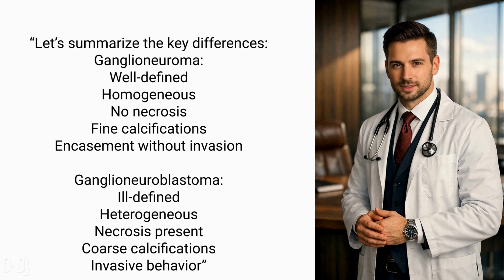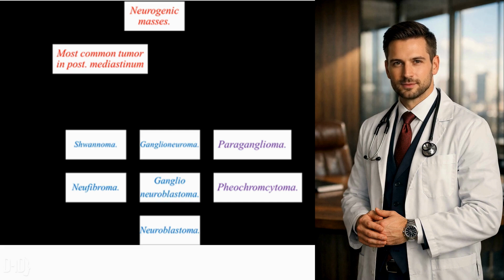coarse calcifications, invasive behavior. In this smart art we can mention the most important and common tumors arising from the posterior mediastinum, which are schwannoma, neurofibroma, ganglioneuroma, ganglioneuroblastoma, neuroblastoma, paraganglioma, and pheochromocytoma.